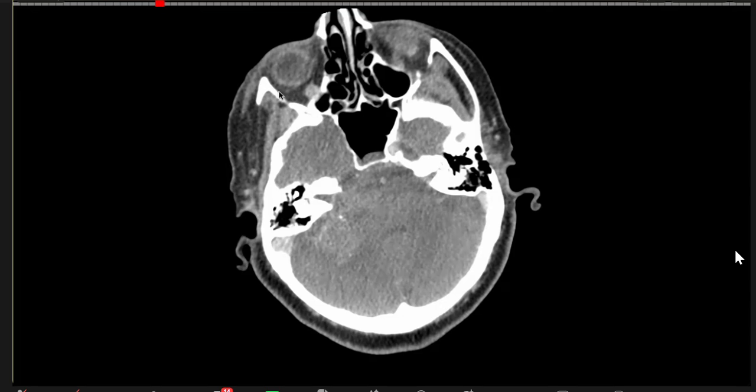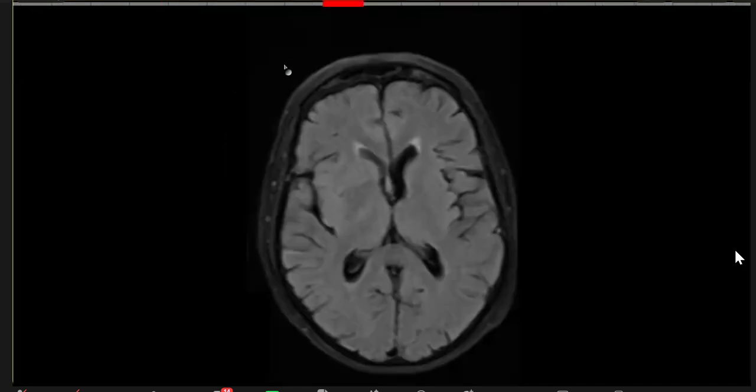Sir, on the findings, along the right parasagittal location, with calcifications, an aggressive lesion, it could be chondrosarcoma. Other differentials in this case would be metastasis. Chordoma is less likely because this is off the midline. Other differential less likely could be neurogenic tumors like schwannoma.